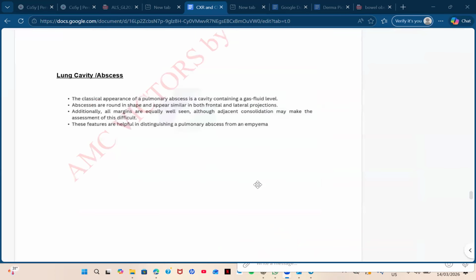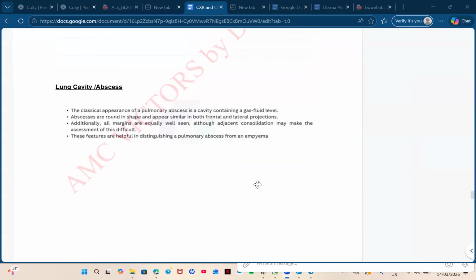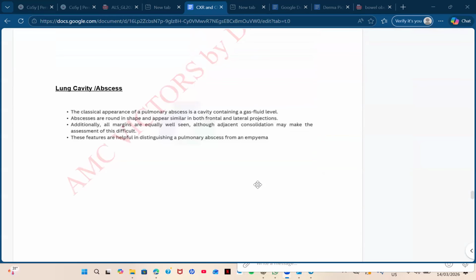Okay, next. So how does a lung cavity or abscess present, doctors? Lung cavity or abscess presentation, tell me.